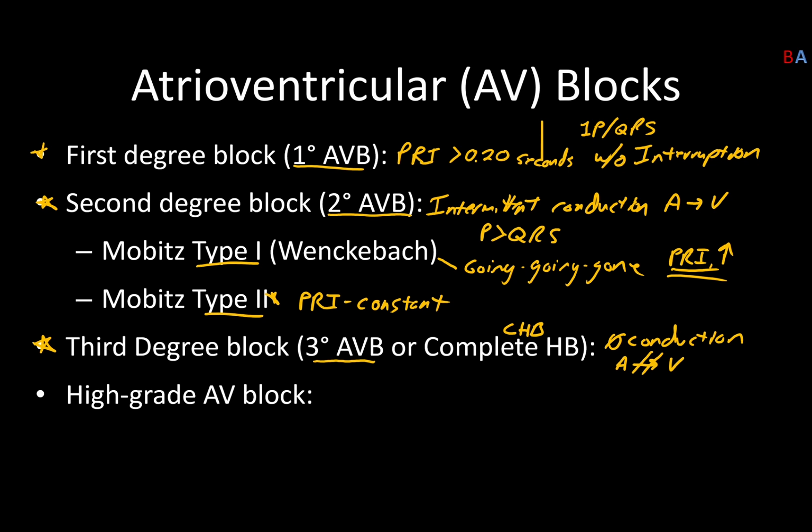So for you advanced arrhythmia folks, I went through all this really quick just so that you still had that content to refresh your memory with. The part that I'm going to take you to beyond what you learned in basic arrhythmia is that with our third degree blocks, you are actually going to be responsible for identifying if it is a junctional escape or if it is a ventricular escape.